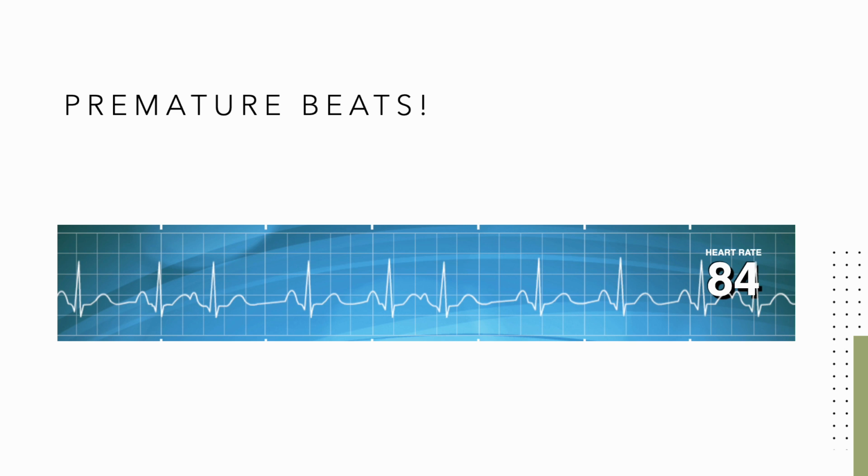Speaking of that, the morphology is very important in determining where the premature beat comes from. If we think back to my heart drawing where I split the conduction system into three areas, the first area was a sinus area, where there was a P wave before every QRS and a T. The second was a junctional area, where there was no P wave, but still a narrow QRS. And in the final area, the ventricular area, there is a wide, bizarre QRS. They're stuck on those dang back roads with no highway.